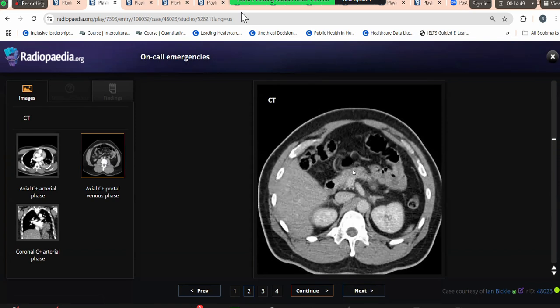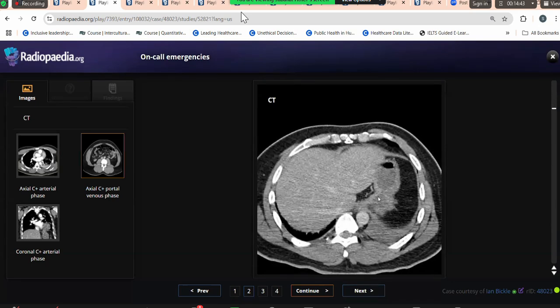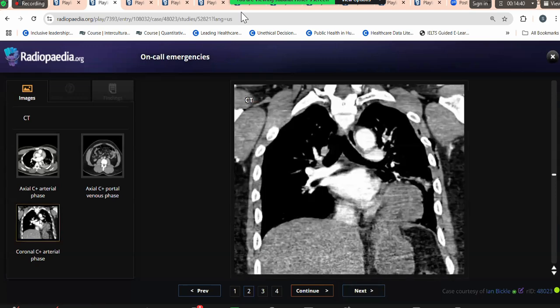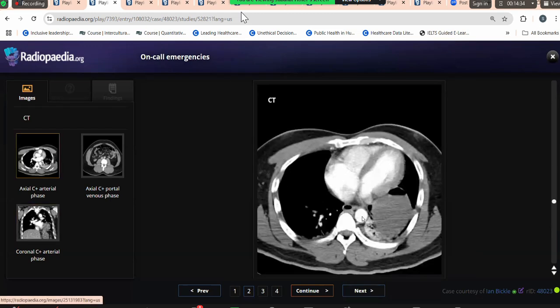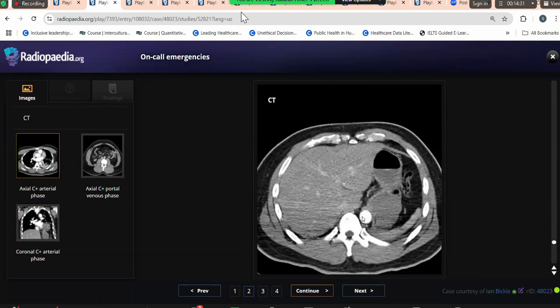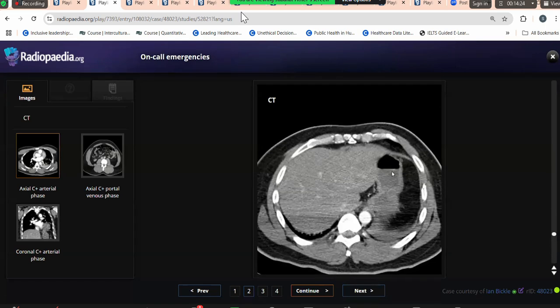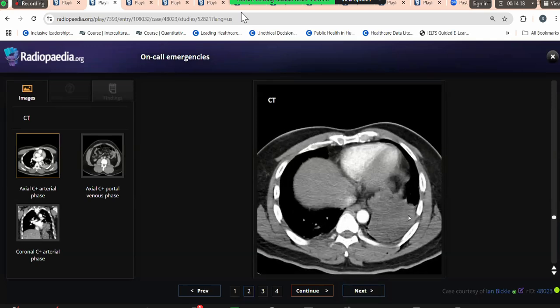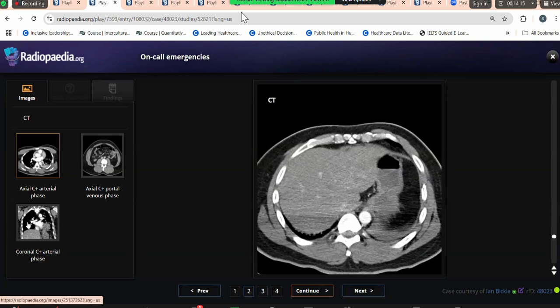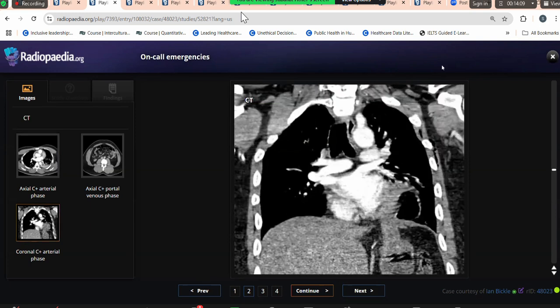This is a traumatic diaphragmatic rupture, which has led to the stomach going up. When you see the coronal, it would become very obvious, but that is why the examiner would insist on telling you to tell us on the axials. And the candidate did give the differential that this could be stomach, and that is why it was okay for me. But try to trace the viscera. Once you trace the viscera, it would always be easier. So this was a traumatic diaphragmatic rupture with the stomach part of it going up and forming a waist. So this was gastric, the stomach moving into the thorax.